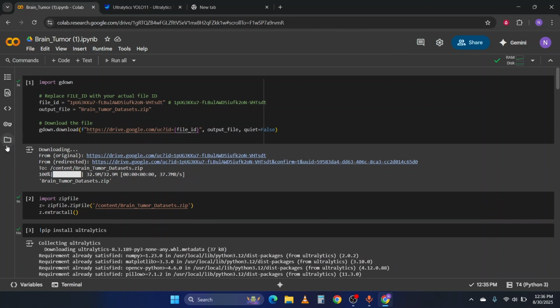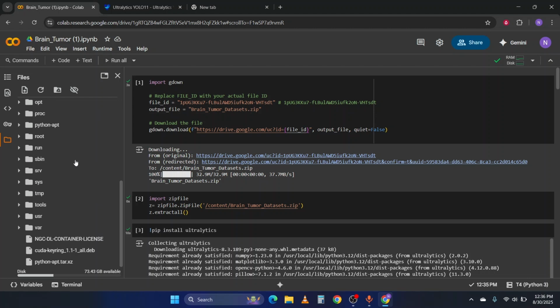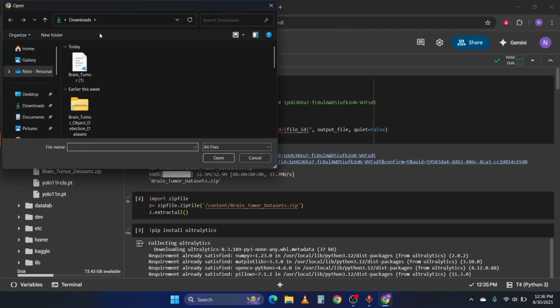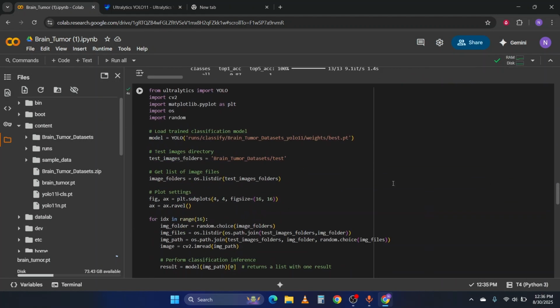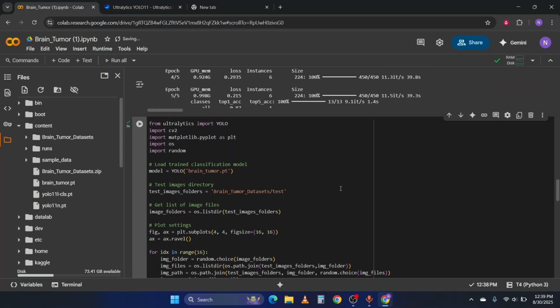Now let me upload the model which is trained on 50 epochs. Okay. Let me come back when this upload gets completed. Okay, so my upload is completed.